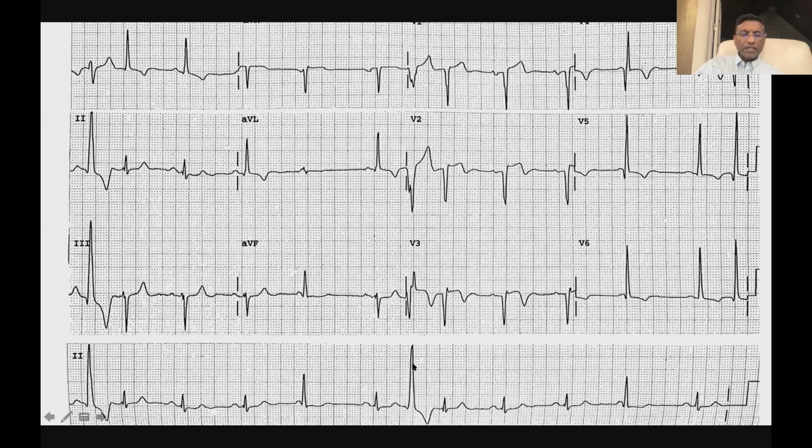What's a good way to tell? Look at this QRS complex, the full kind of, let's say, unadulterated PVC, and then look at your normal QRS complex as it conducts down the usual conduction system. And I think you'd agree with me that this is kind of a mishmash or a combination of this one and this one. If you could add up that and that, you're kind of going to get this, which is in effect what a fusion beat is.